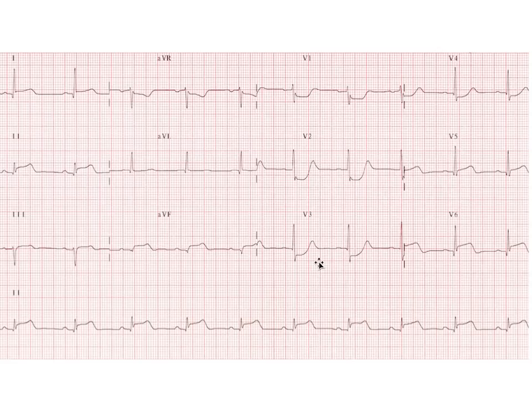If it's like a mirror image, what's the electrical rhythm going to look like on the back of the heart? If we held a mirror up to the back side, V1, V2, and V3 are actually going to be elevated. They're going to be ST elevations, depending on how you're looking at that specific electrical depolarization.